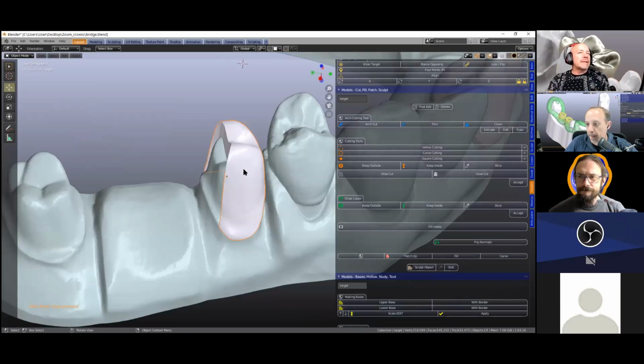Someone else has said that maybe there's copings we can use, like zirconia copings, to block out devitalized gray or black teeth. We can make a thin layer, which is opaque. Dentists can put it on to mask it and then put a nice restoration over the top.